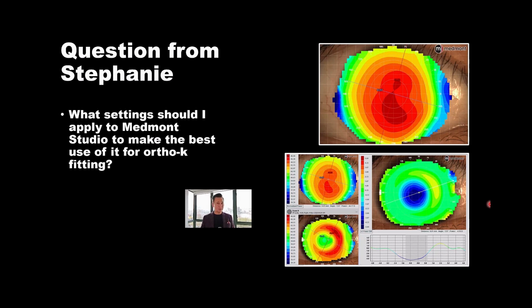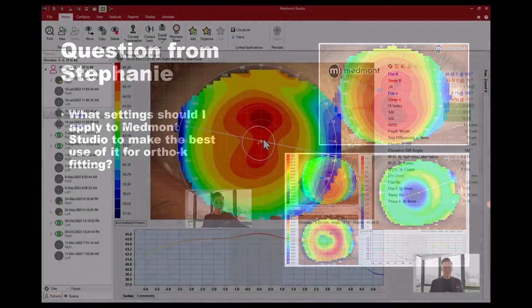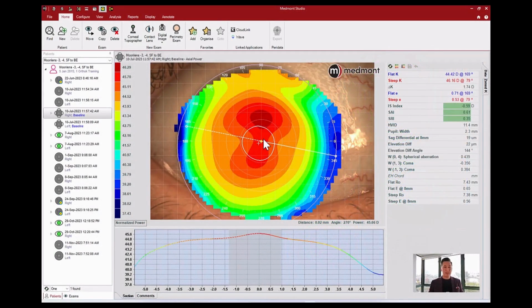And there's a number of them both for version 6 and version 7. So those will help to give you some idea of how you want to manipulate your software, both from the default, but also in other directions as well. And maybe we'll just go through a quick example. Okay, here's an example of baseline topography.